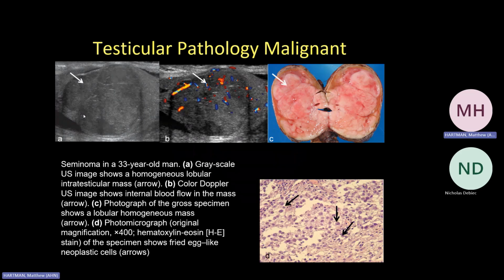This is opposed to this case, where a patient feels a scrotal lump. Here's our testicle, not homogeneous. We can make out the margins of this intratesticular lesion. Next question, solid or cystic? Well, this looks like it has meat to it, as opposed to our anechoic cyst. This is a solid mass. This is cancer until proven otherwise. The patient gets an orchiectomy, and this is a seminoma.